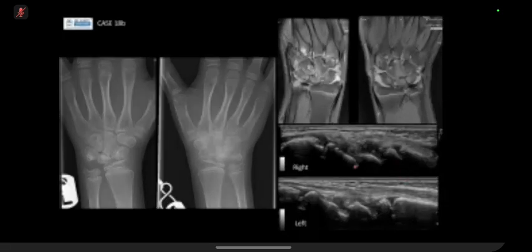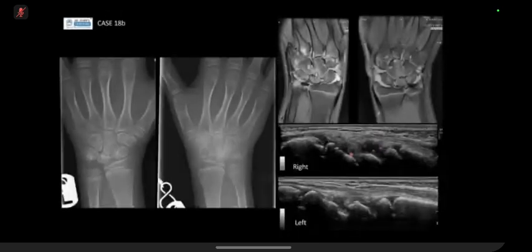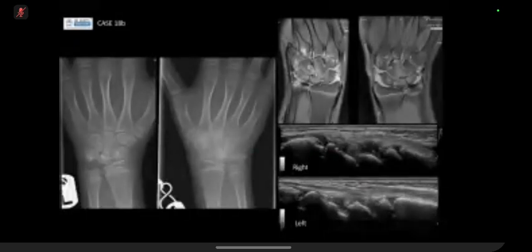Now, on ultrasound, this is your classic view of your wrist joint, the radiocarpal joint in the midline of your wrist, and the black bit shows synovial thickening. The only bit that I didn't give you was the Doppler, which would show vascularity, suggesting active synovitis. In arthritis in a child, if you just had treatment, you can have a lack of Doppler vascularity, but you still have synovial thickening persisting for a bit until the treatment starts to kick in. But you can just notice that on the right side, it is a lot worse than the left, which corresponds with what the patient's symptoms are.